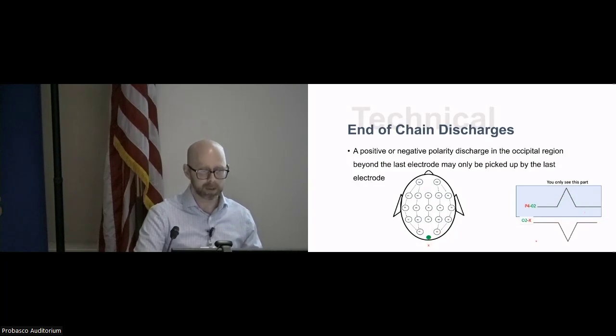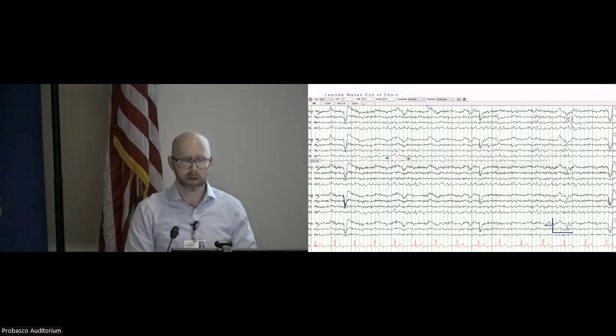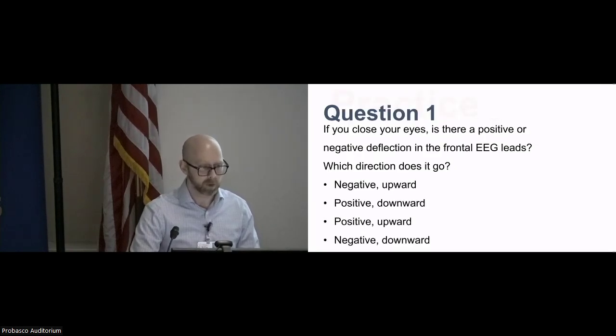Like we talked about, epileptiform things are typically negative polarity, so it's the reverse of this. They don't go apart, they go in towards each other. This is an example where I did this trick for you, adding an extra electrode to compare it to, and you see how these would go apart, where you could put the little positives in there. So this is where a more advanced montage may come in handy, just to give you the concept of why that would be called a positive discharge.